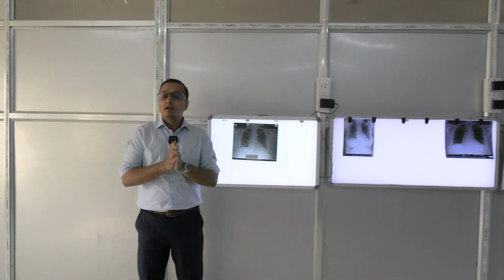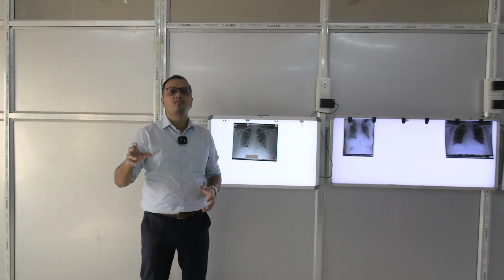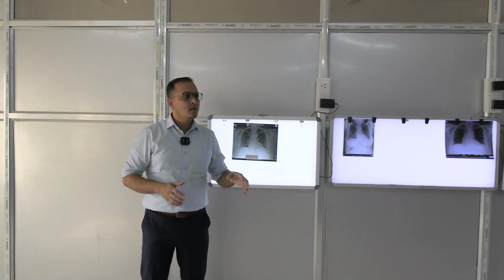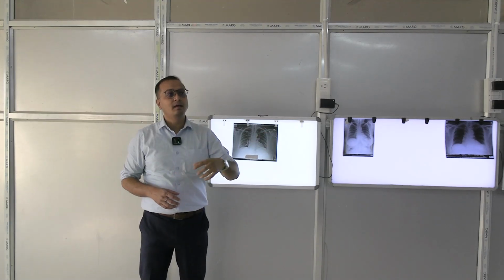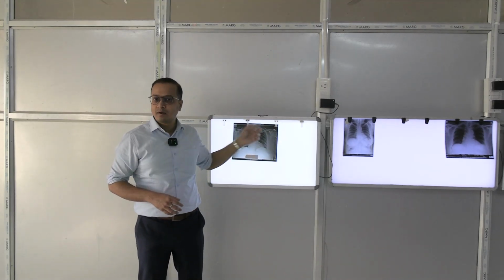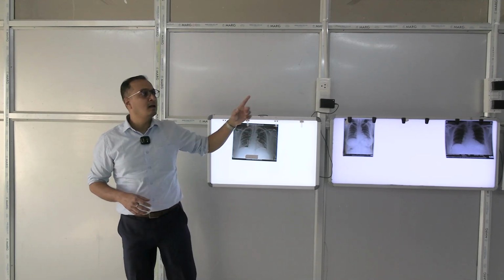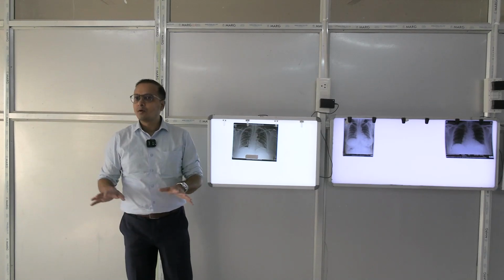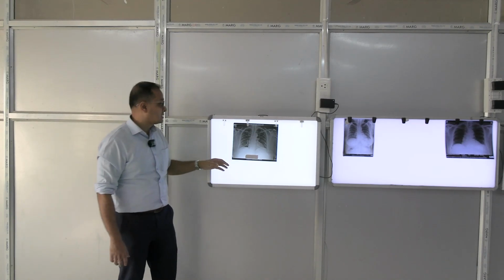If it is not marked, even though we understand it fully with 100% accuracy and 100% confidence that this belongs to the right side, we are not going to make a comment on it. We will comment only once we see this particular marking when the person is taking the picture. So, we have to mark it. The radiologist or the technician has to mark the right side and left side, then only are we going to say that this is right side and this is left side, or else we are not going to address anything, no matter how well we understand this.